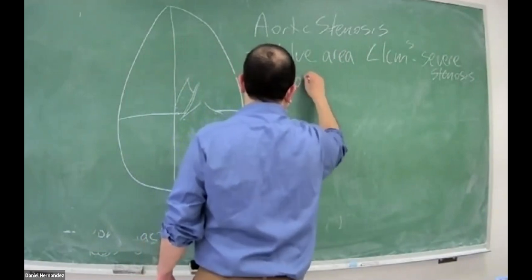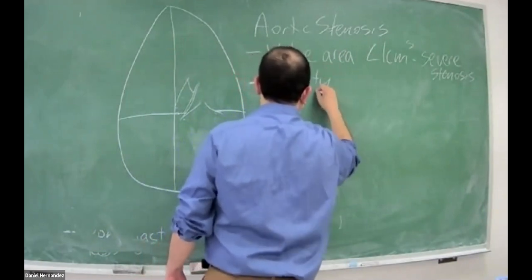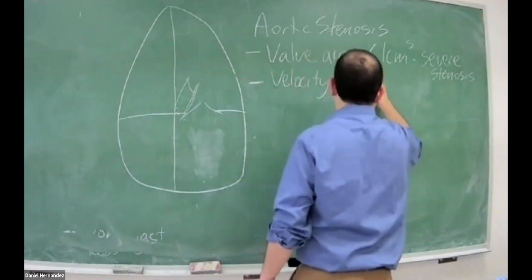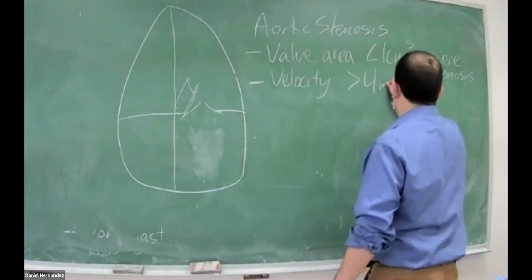Velocity greater than 4 meters per second.